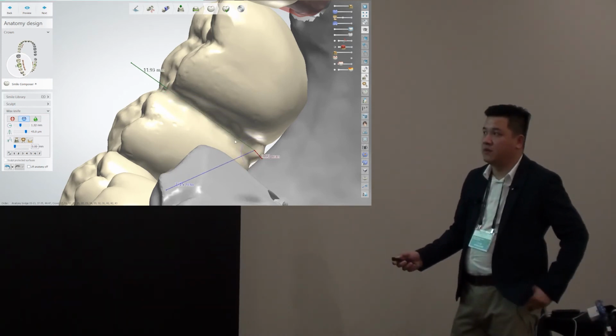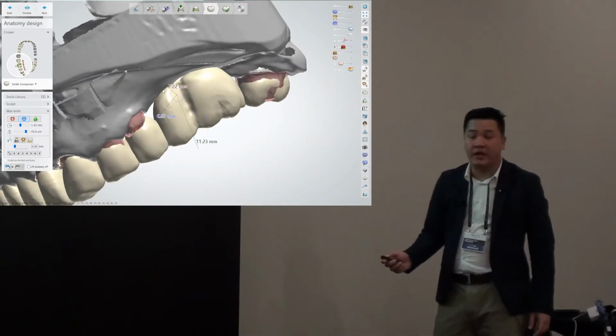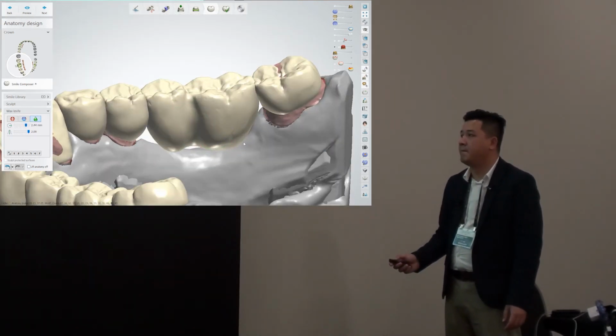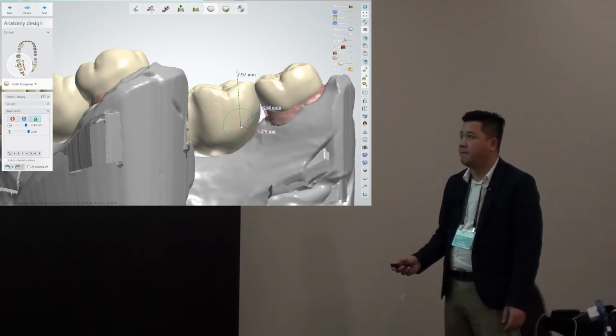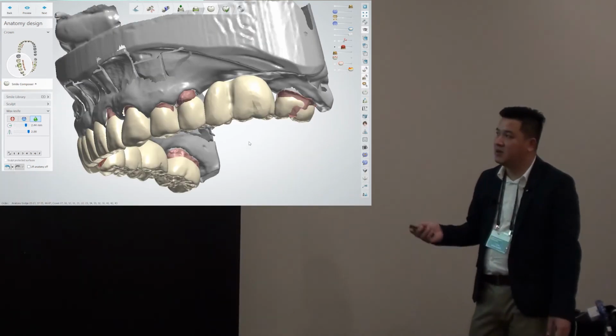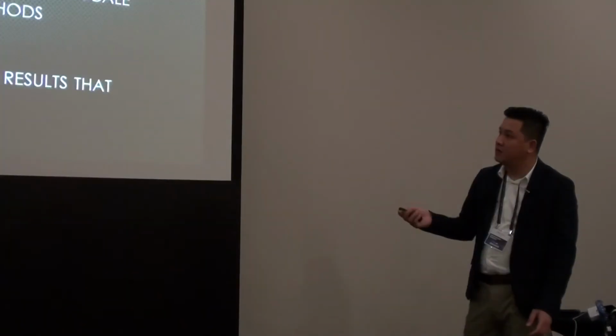But it makes very short work of something that could have really ruined your day. And of course we connect all this together, make sure everything looks nice and hygienic. And that's our final result there.